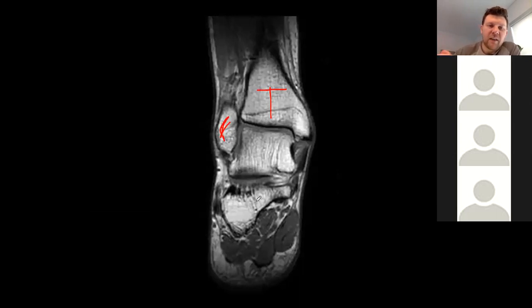Do you think you're at the anterior aspect of the ankle joint or the posterior aspect, and why? More anterior, with the sustentaculum tali there. Good. It's all using your context clues. So we know the calcaneus narrows more anteriorly, and we have the sustentaculum anteriorly. So good. You're at the anterior ankle joint.